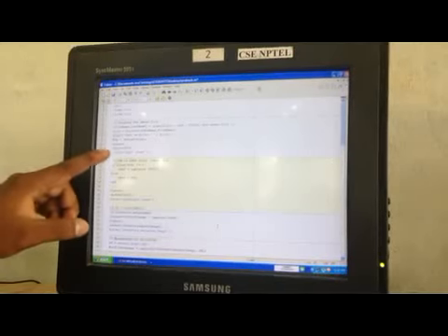The syntax imshow is provided for displaying the selected RGB image. Finally, the title for the image is input image. And then RGB to grayscale conversion. The main intention for converting the RGB to grayscale image is to make the determination of hard exudates clearer.